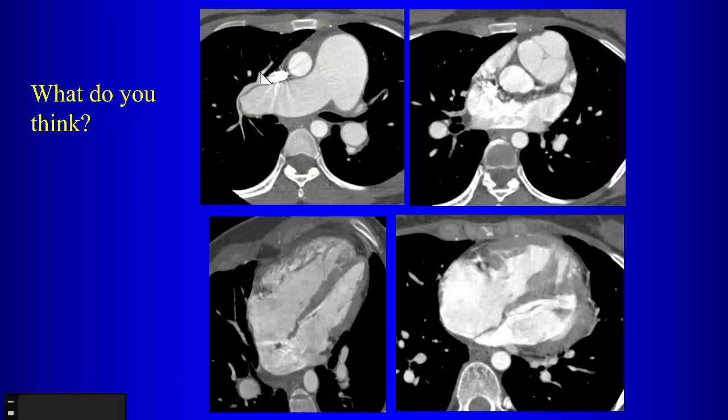I mean, someone described this as the seagull sign. Sometimes it kind of looks like a seagull, I guess. But it's very common to see pulmonary veins like that going into the superior vena cava when you have a sinus venosus ASD. So the point is, you find the sinus venosus atrial septal defect. Here it is, really up high. This guy over here is what? That's the junction of the SVC and the right atrium, right? So this defect is really high. It's up there near the junction of the SVC, so that makes it a sinus venosus atrial septal defect.